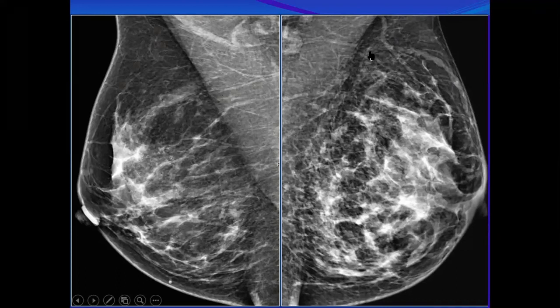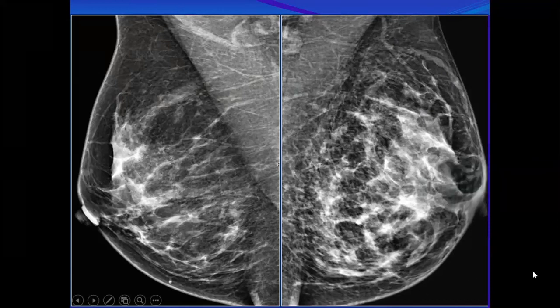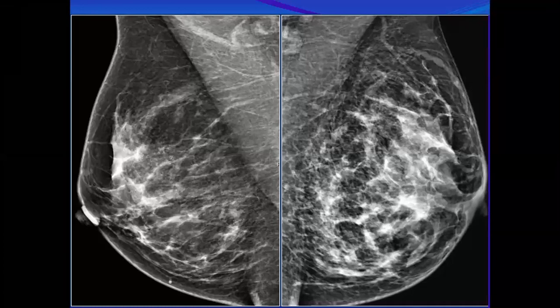Compare the two sides and look at the vascularity. There is increased diffuse vascularity. So we are dealing with malignancy, I think. Suspicion, yes. I will go for BI-RADS, with associated features, BI-RADS 4C. You see, because it can be mastitis. You cannot guarantee. It can be mastitis.